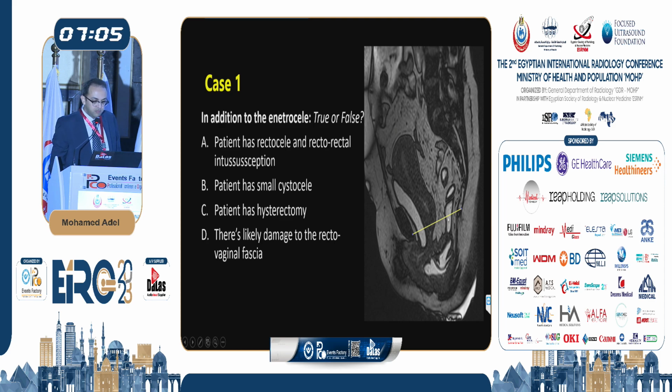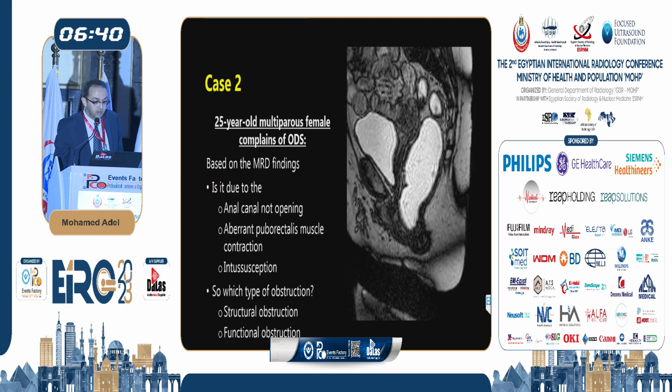There's also, true or false, can you see a rectocele? There's a bulge beyond the assumed anterior. I guess there is. Is there a small cystocele over here? Yes. Is there rectal intussusception? Yes, the rectal infolding within. And there's also probably damage to the rectovaginal fascia, although we don't see it, because there's a lot of elements of the pelvic floor that are a little bit weird. You don't really see it, but you see when it's destroyed.